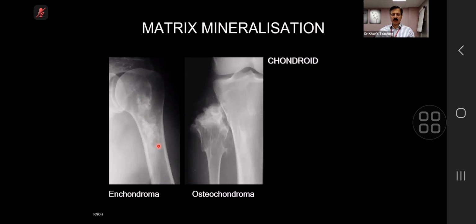And this calcification, remember, I taught you in the second chapter, 3 words: rings, arcs, and nodules. So ring and arc type of calcification is quite pathognomonic for cartilaginous tumor. Because the differential diagnosis is bone infarcts, where it is geographical, serpentine calcification.